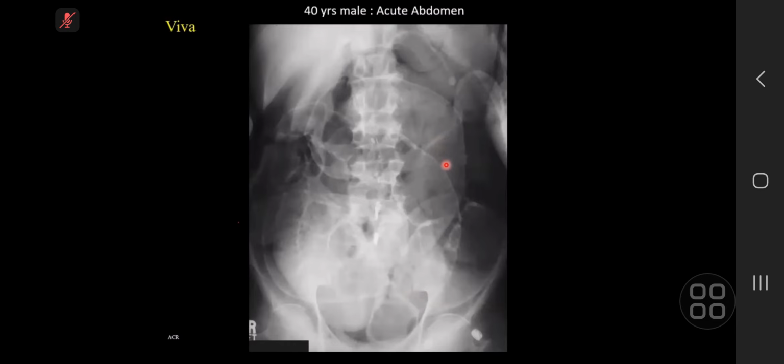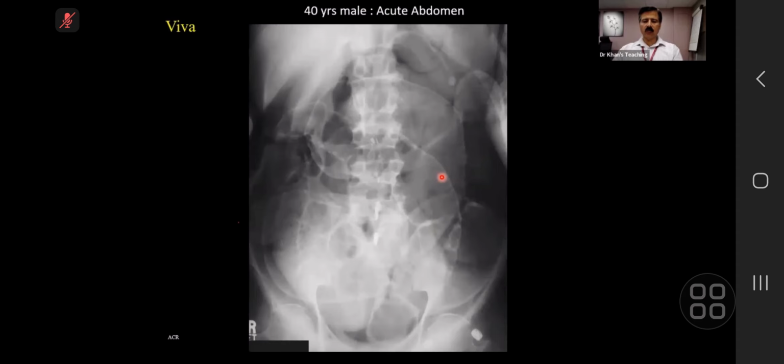Now, in your exam, pneumoperitoneum will always be shown on a supine abdominal film. At FRCR level, nobody is going to show you a chest X-ray for that. So Rigler sign is one of them, where you see the outer as well as the inner surface of the small bowel. I warn you, when small bowel loops are dilated and distended, and they are projected over each other, at times we get what we call a pseudo Rigler sign. So you might confuse it. Now, so this is Rigler sign.